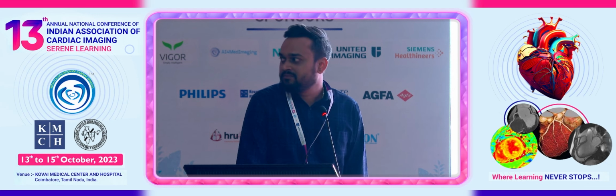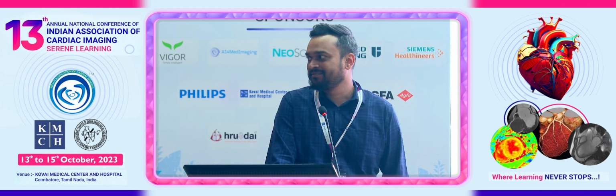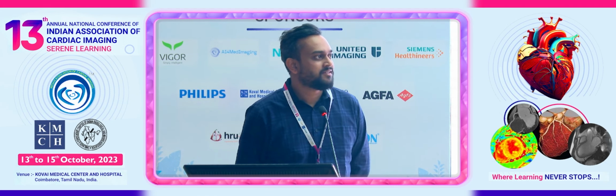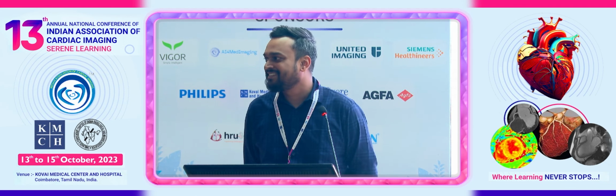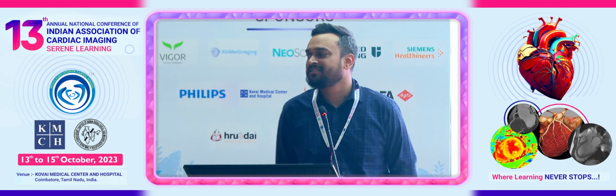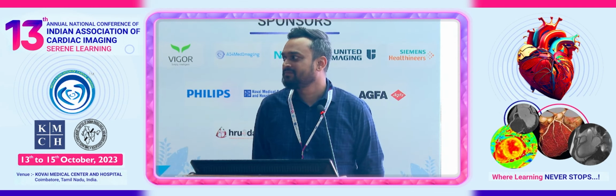Do you think a contrast MRI angio would help? No, for the brain it is inferior to CT. Do you think it would have better spatial resolution than CT angiogram, an MR angiogram? No. But he says no, not to CT. He went back and he says no. I'm surprised. Actually, CT is supposed to be quite good, but compared to DSA, I think DSA is better. Yes, sir. But at times the smaller ones, okay, I understand. Yeah, possible. So, very good.